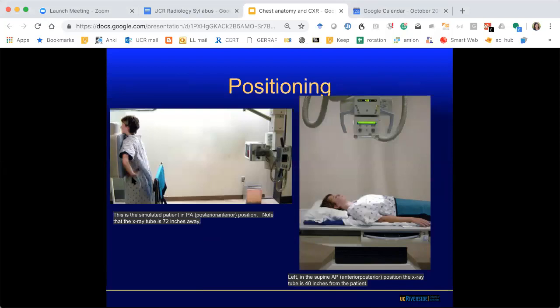This is also true in abdominal radiographs because, for example, patients with bowel obstruction, if they are supine, you don't see the fluid levels. When they're upright, you'll see the fluid levels. So that's one way to use positioning to your advantage. This is also important in the setting of pneumothoraces. You can have them upright, in expiratory position, to make the pneumothoraces more pronounced and bring out the abnormality.